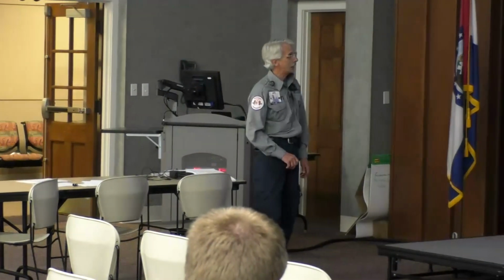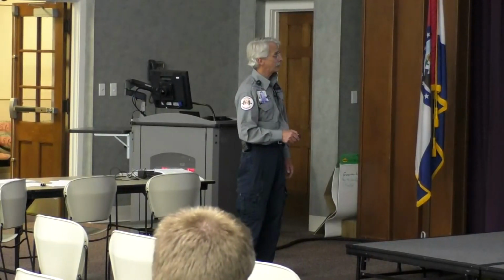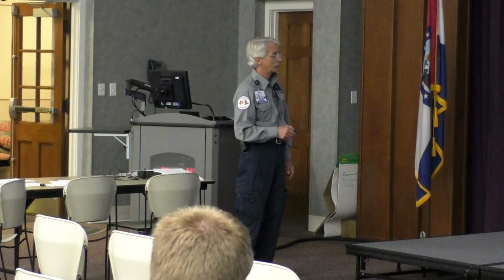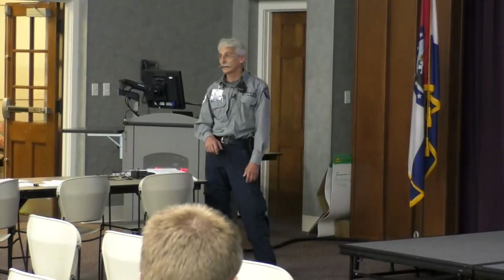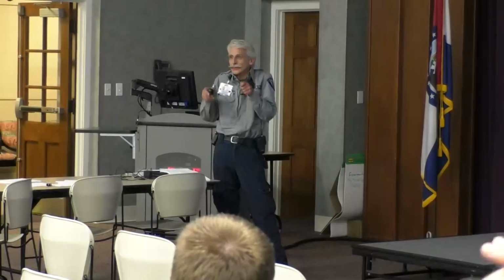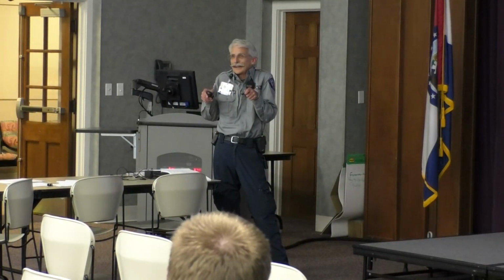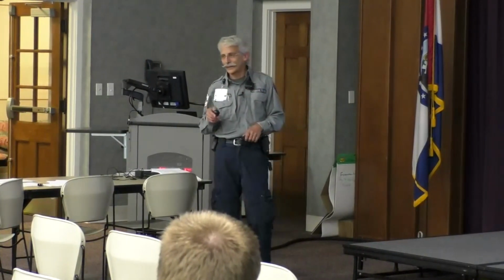So this one has an MI going on, or has elevation going on, in 2, 3 and AVF, and so we're going to call it a definite maybe on this patient. I know you don't have it right in front of you, so you can lay a piece of paper on it, and I get that. But that's what we're working with today.